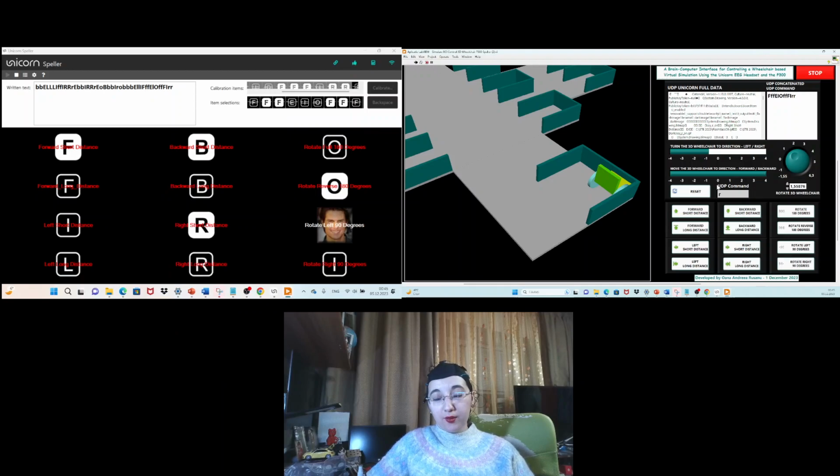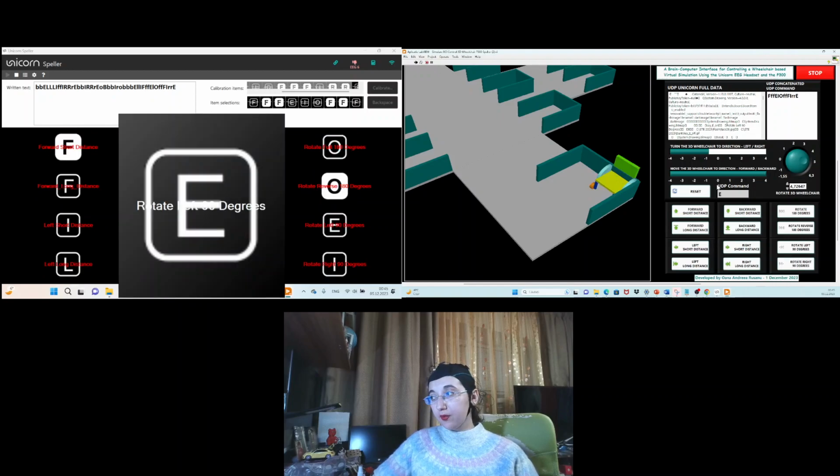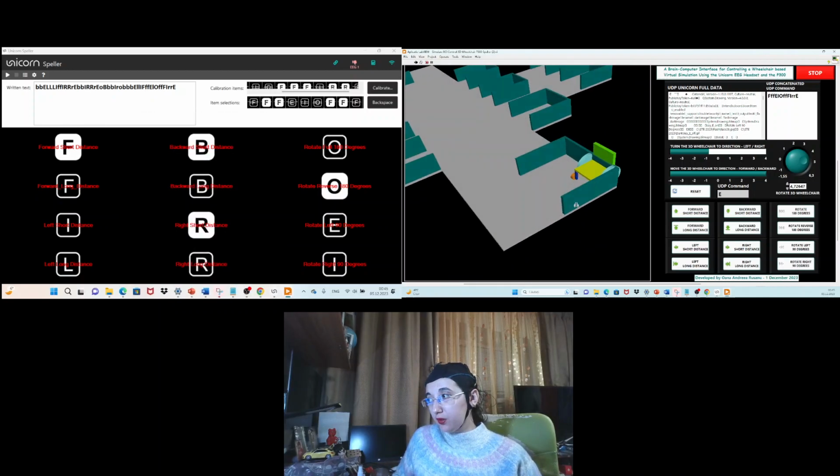I think it is the last one. Yes, so everything perfect. Yeah, I need to check again some values sent from Unicorn to LabVIEW.